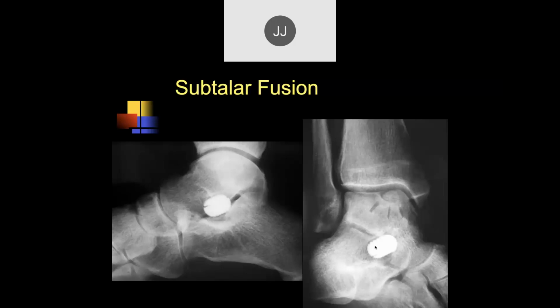That will eventually need a, I don't know how old the patient is, but you might try total joint replacement or fusion. But that's not going to fuse the talocalcaneal joint. It's obviously not going to fuse. At least I don't see any fusion. Do you, John? No, not at this point.